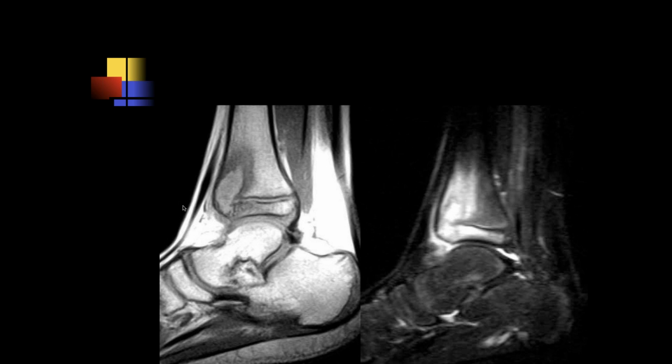This actually looks like a pediatric patient. I see fusion along the anterior physis of the tibia and a lot of edema there, spanning that metaphysis and epiphysis, and there's some soft tissue edema as well. I'd be worried about a Brodie's abscess. Good. Yeah, it's a very typical appearance of a Brodie's abscess. It starts in the metaphysis, and when it gets large enough, it can extend through the growth plate. Usually we catch these before they extend through.